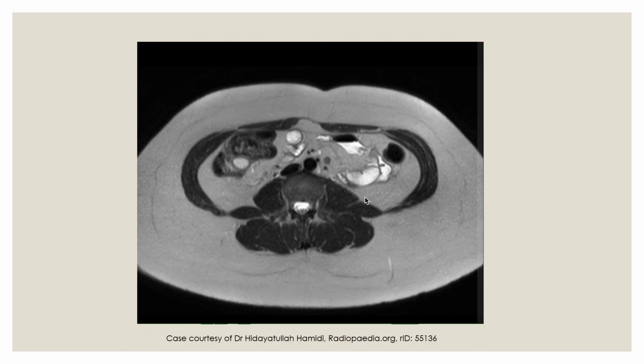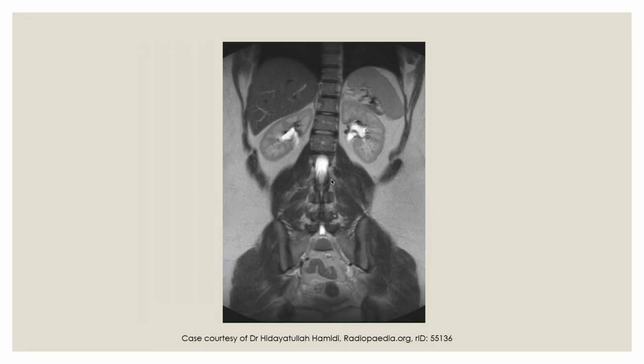Gallbladder pathology is also very readily characterized on MRI. MRI can also be used to further characterize kidney lesions, as well as bowel once we've given contrast, and actually this patient has been given contrast, but not to the extent that dedicated bowel imaging would require.